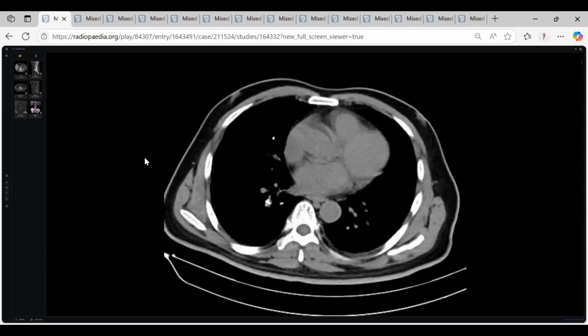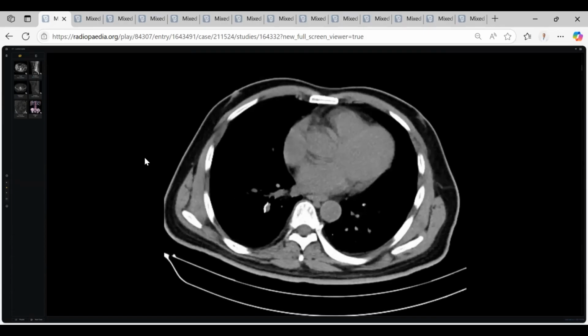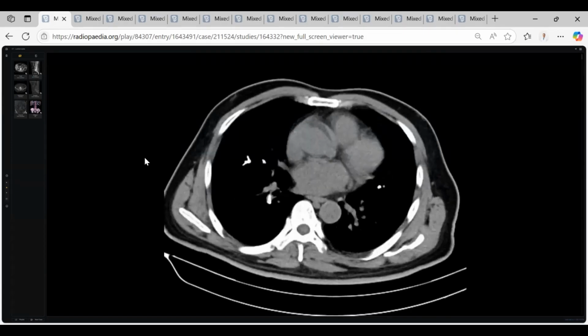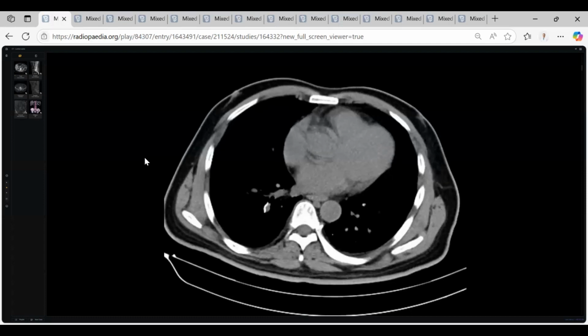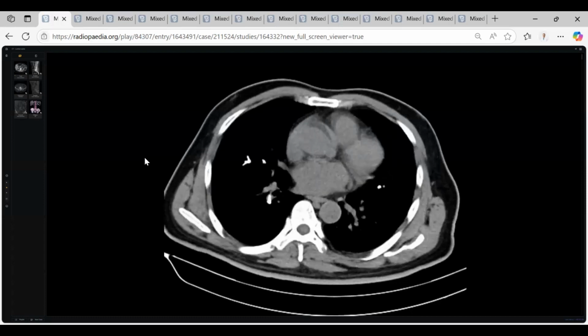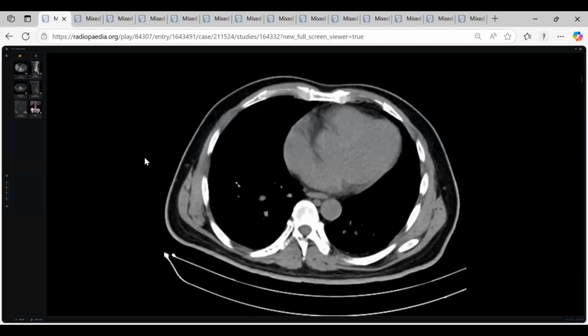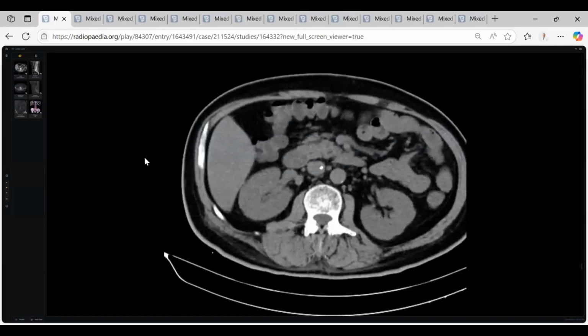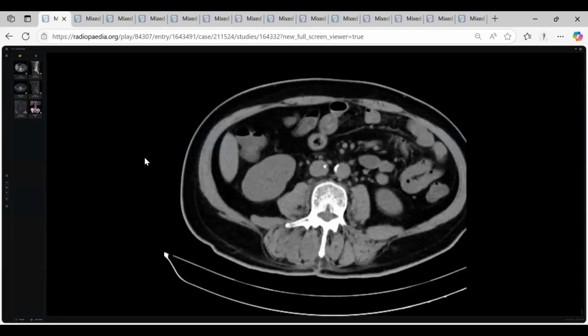pulmonary vasculature. Doctor, what happened for the pulmonary vessels here? So they are inside it? Okay, so they are not calcified, they are cement objects. Yes, sir. So this is a cement embolism, pulmonary embolism. Okay. And what happened in the IVC?